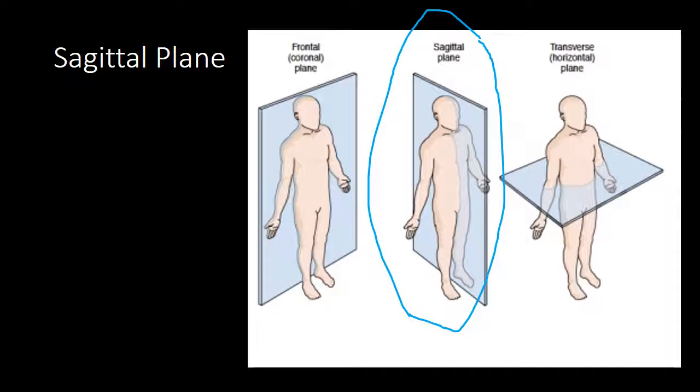We will start laterally on one side of the body. I will point out when we reach the midline of this image set, and then from there, we'll move laterally toward the opposite side of the body. Those images we will see later in this presentation will look very similar to these next few, since those structures we will look at have symmetry at the midline.